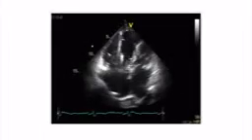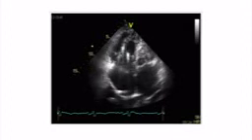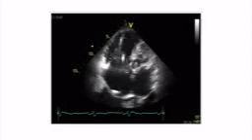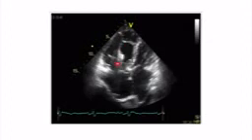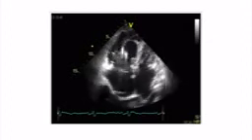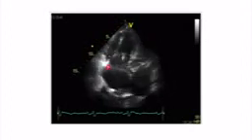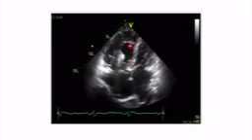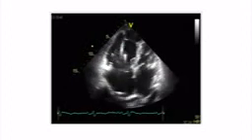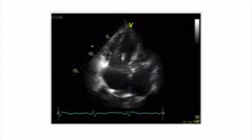Here is a patient, again, with a dilated right heart. I think everybody can appreciate that the right heart is larger than the left heart. In this case, we have these strange echoes here, which are pacemaker leads. We do not have right ventricular hypertrophy. The wall is relatively thin, and we do have poor right ventricular function. Now, in this setting, the likelihood of tricuspid regurgitation, I guess, is very high.